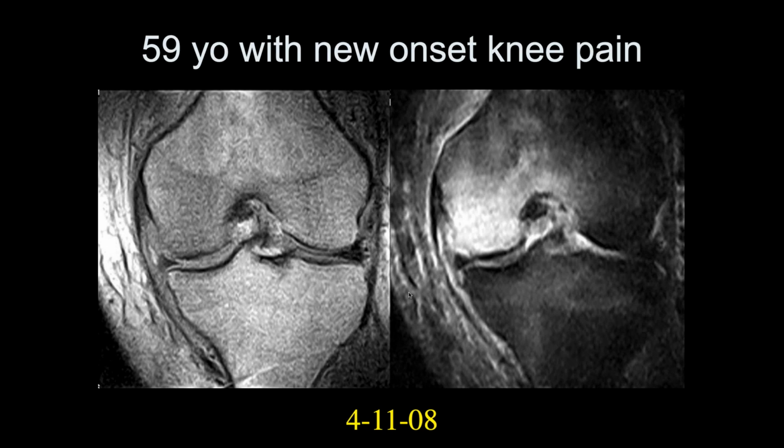Okay, so 59-year-old with new onset knee pain. Looking at the medial femoral condyle, we see extensive bone marrow edema of the subchondral bone. There's actually some irregularity of that subchondral bone plate, I think. The overlying articular cartilage, I can't really discern, but I think it's intact. But I would definitely be non-weight bearing. I think there'd be concern for progression.